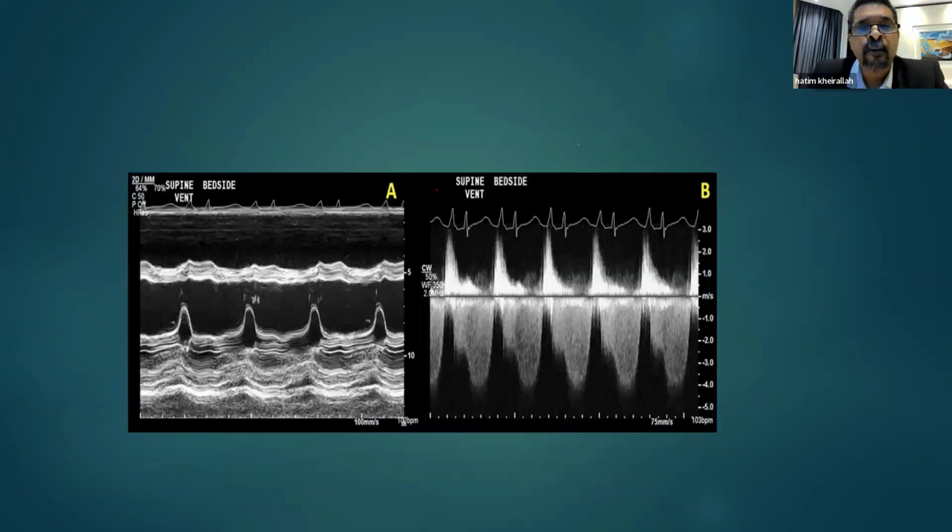Okay, good. So if we go here, now we see again the valve is closed prematurely because it's supposed to be like this, and then we have here. So it is closed prematurely. This is one sign of severe aortic regurgitation, especially the one associated with high LVEDP, which is either the decompensated chronic or the acute AR. So when we see this one, we are either dealing with severe aortic regurgitation decompensated or acute severe aortic regurgitation.